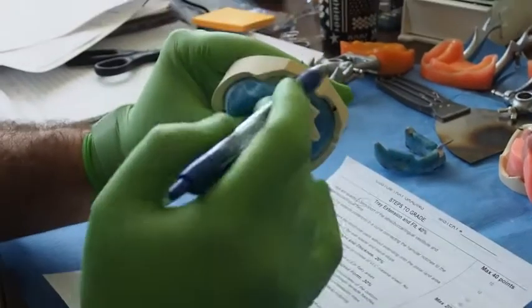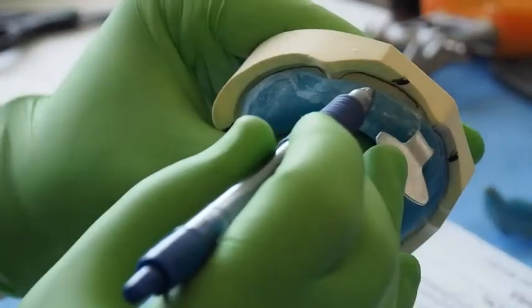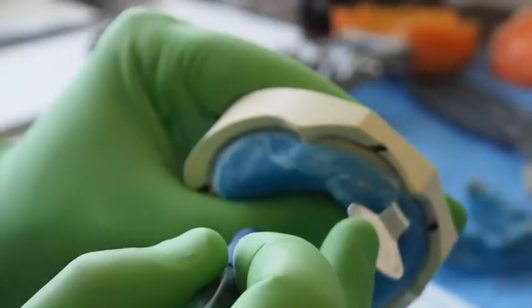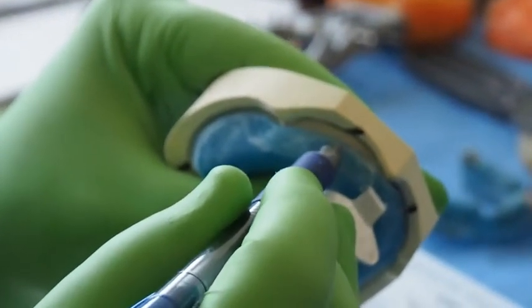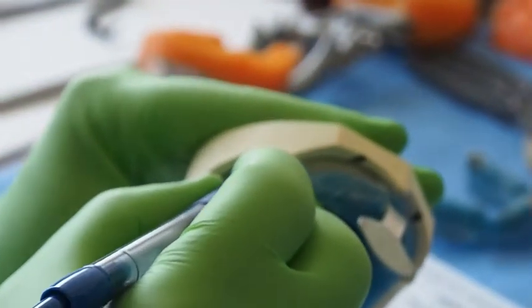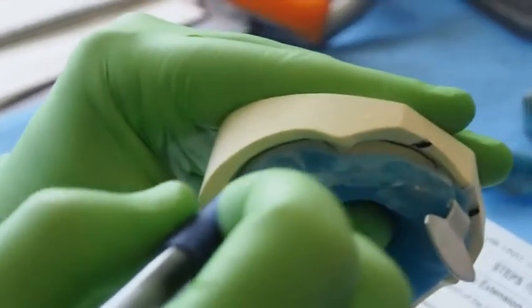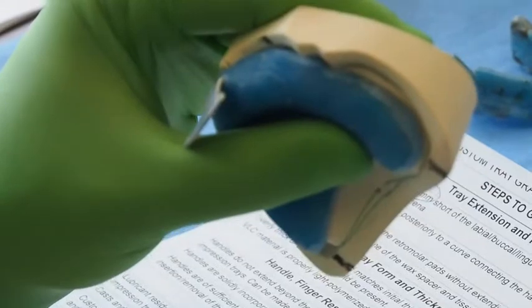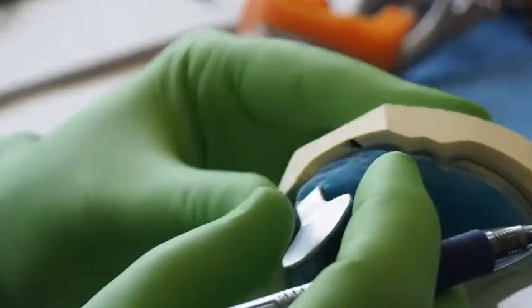For example, look at this. Can you see it there, Willie? Mm-hmm. Yeah, I'm about 6 millimeters away from it. Now, that will be taking some points off. Do you see how the frena here is not completely free or relieved 2 to 3 millimeters? On the other side, we got all this part here exactly at 2 to 3 millimeters, and this is exactly what I'm looking for. And that's exactly what we're going to be checking.